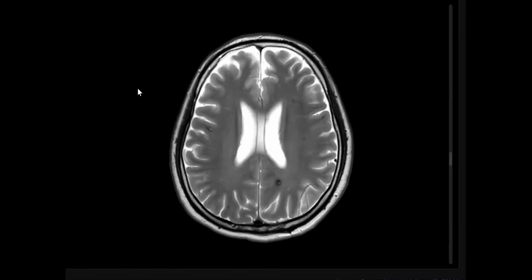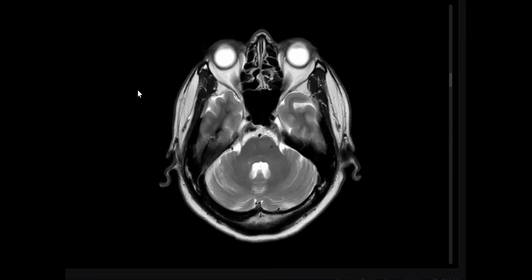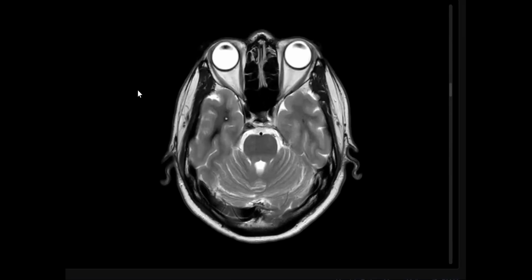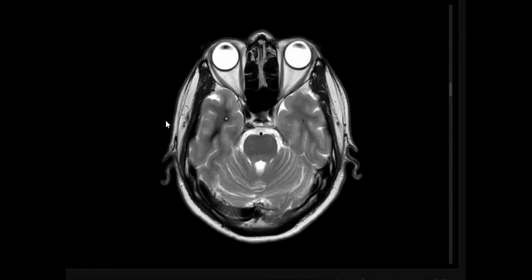Which sequence do you want to see on MRI? I will look for T1 and T2. There are multiple lesions of variable sizes. Again, I can have the same observation. They are hyperintense in the same distribution with a surrounding hemosiderin signal void rim. And I want to have a look if there is any edema associated with them. The right temporal lesion has no edema around it, no mass effect.